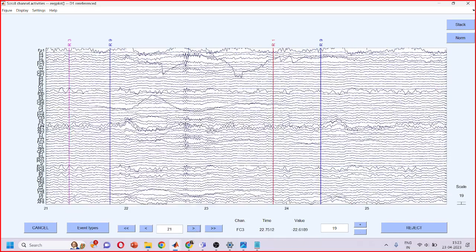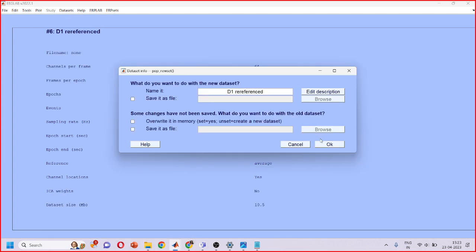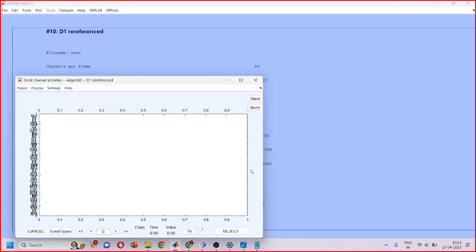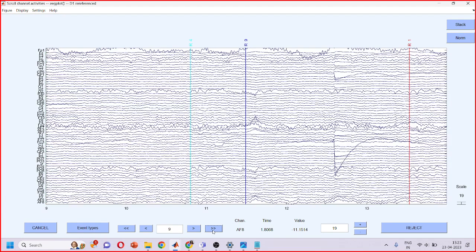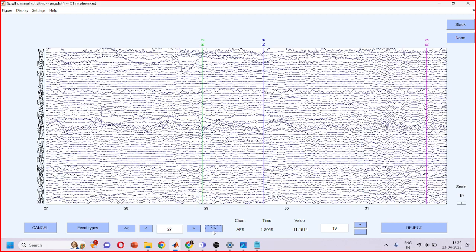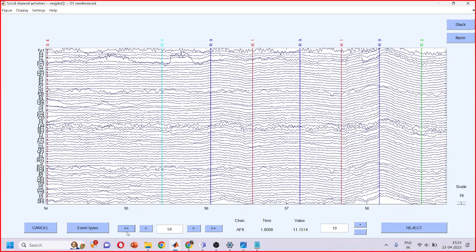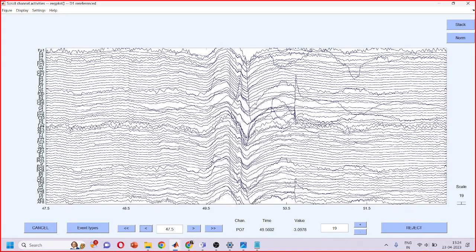So for example, here, this part can be removed by clicking on reject. And then if you go ahead to plot the data, you'll see that that part was removed. Since it was removed, we cannot make out that it was removed. But yeah, this is one way to keep a check that your data looks clean and there is no big, disastrous change there.